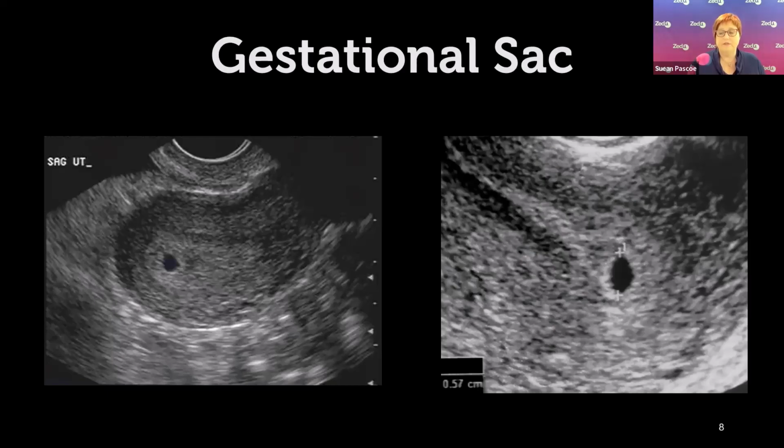In early pregnancy, if the double decidual sac sign is present, it's highly suggestive that there is an intrauterine fluid collection and that it's probably an intrauterine pregnancy. But we only see that double decidual sac sign in 50 to 60% of cases. So if we're not seeing the double decidual sac sign, the absence of that sign doesn't confirm a pseudogestational sac of ectopic pregnancy. We need to wait and see what's going to happen.